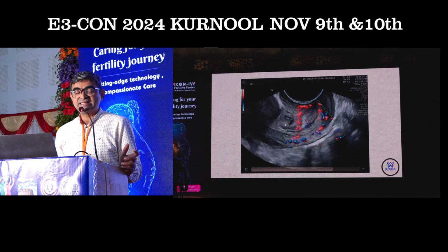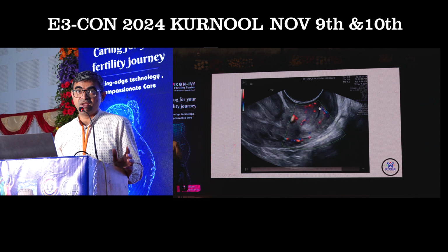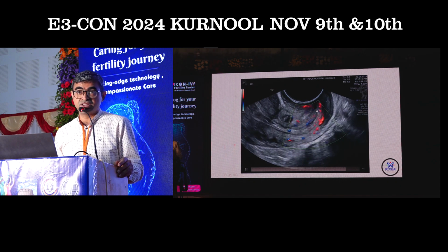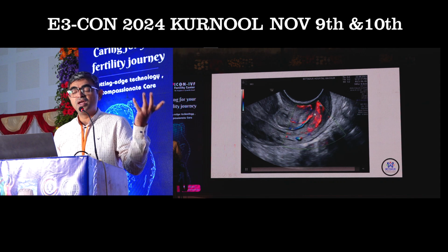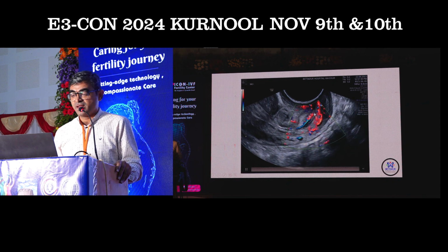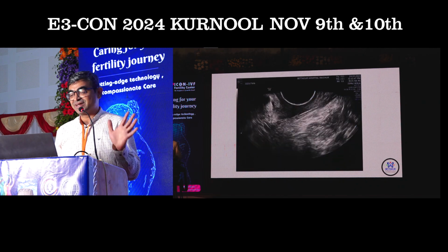introduce. So these lesions at the cervix, endocervical lesions, sometimes may cause problems, sometimes even with HSG also. So you will not be able to push the dye properly, you will not image the uterus as well. So the importance of doing this, there's no other topic for me now, only you will be seeing cervix.